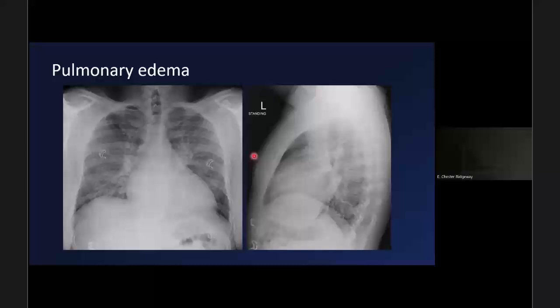I will say there is a caveat that I've noticed being out here in Colorado. I don't know if it's the altitude or whatnot, but because I come from the Midwest, as Steve mentioned, everyone's bronchi here, or the walls, are slightly thickened. It's like a thing here. I don't know why. I haven't been able to find any literature on it either. Also, everyone's pulmonary arteries are slightly larger than at sea level. Again, I suspect it has to do with the altitude. I have not been able to find any literature on it, but it has been a very constant observation for the last year and a half. So just keeping that in mind.